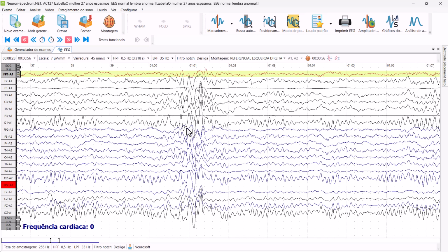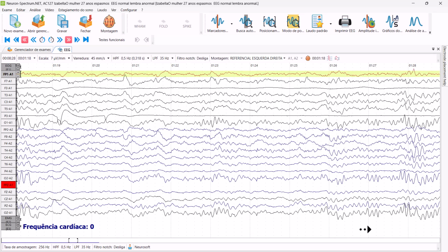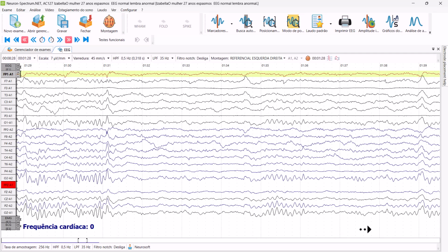So a spike wave aspect starts to appear here, but in fact it's just a mixture. We have a mixture of alpha rhythm and slow rhythms. So interesting. You have drowsiness, hypersynchrony, and an alpha rhythm together. You can also call it a fragmentation. And what starts to appear? It resembles a spike wave.